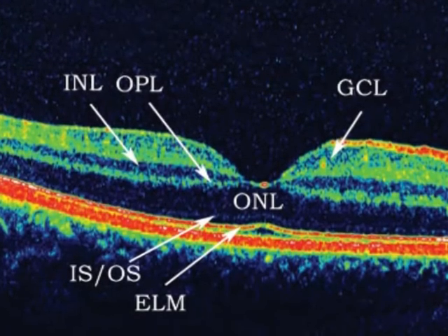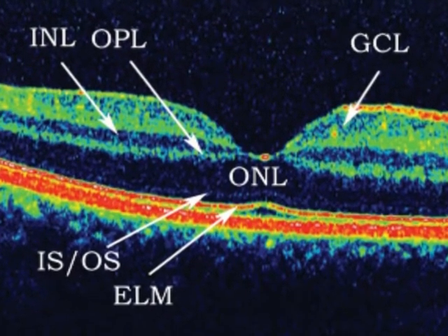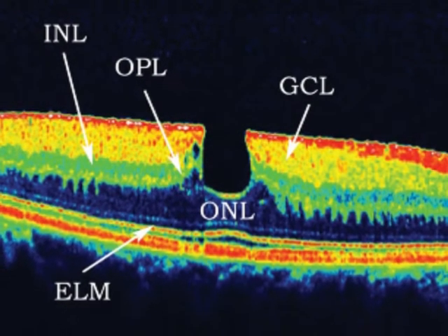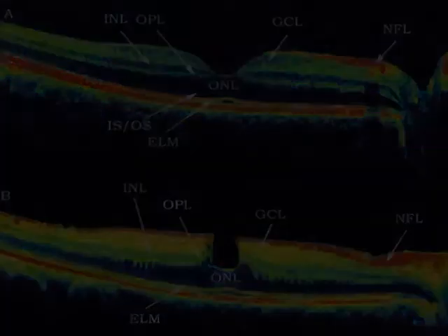With spectral domain OCT, we observe that the fovea is on the level of the outer plexiform layer in a normal healthy retina. If we look at an eye with macular pseudohole, we can see that the fovea depression remains in its place. However, the outer plexiform layer is pulled above this level, probably through the traction of epiretinal membrane.